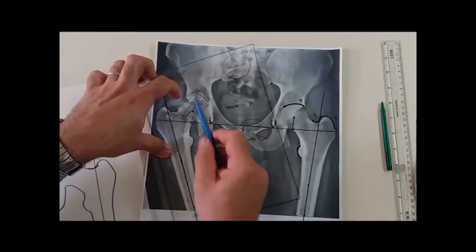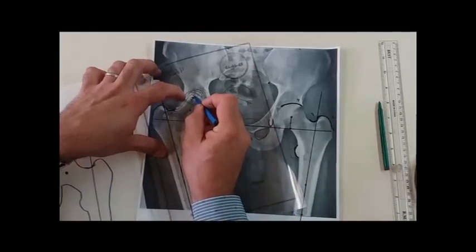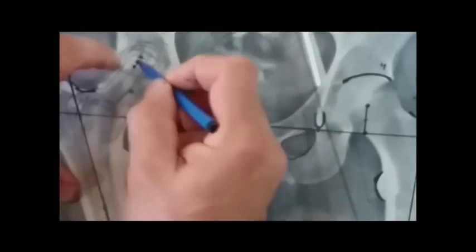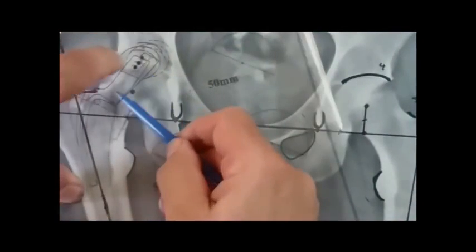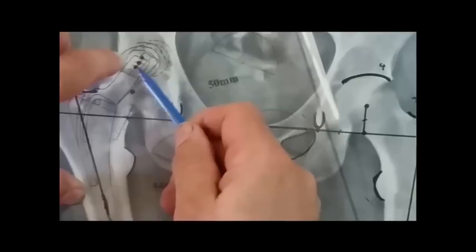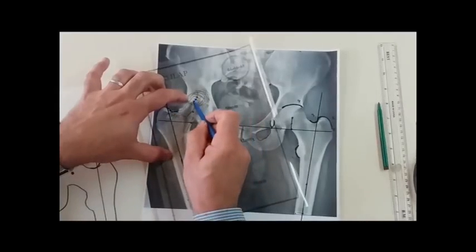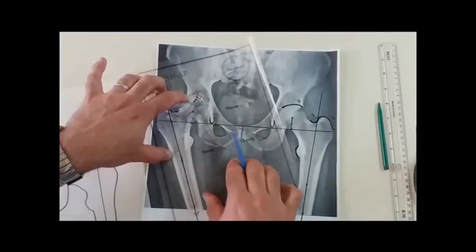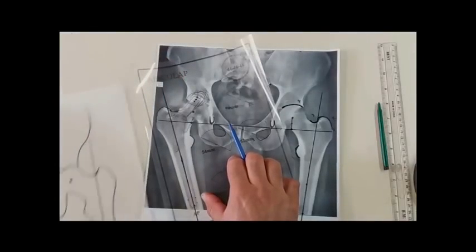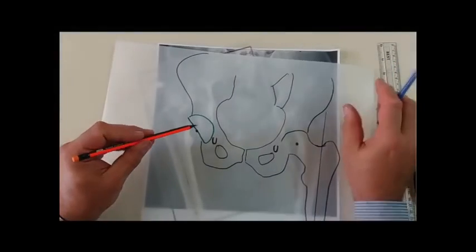Another point I should highlight, I repeated, is that these small circles coincide with the center of rotation in the stem. These three, small, medium and large. This denotes what? The center of rotation regarding the small size neck, medium or large and even more. So my future center of rotation for the femur would be either this point or that one according to which type of neck I chose. So also my tracing paper, I keep this relation of this template with the radiograph, and I bring my tracing paper. This is the center of rotation. My future.